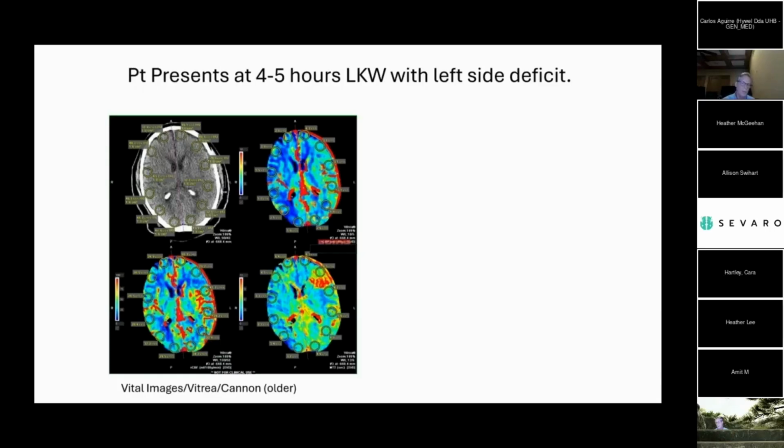We're going to use a diffusion weighted image to see whether or not we read the exam correctly. So here are the parameter maps. Here's the MTT, here's the CBF, and here's the CBV. Now, when I don't have a summary map, even when I do have a summary map, I typically read the MTT first and compare it to the CBV before I do anything else.